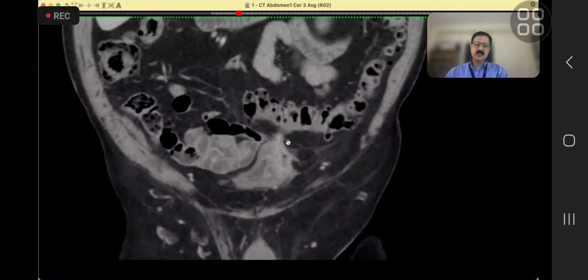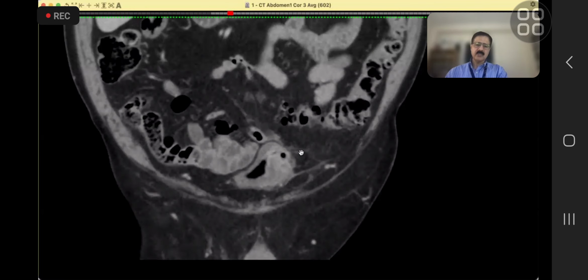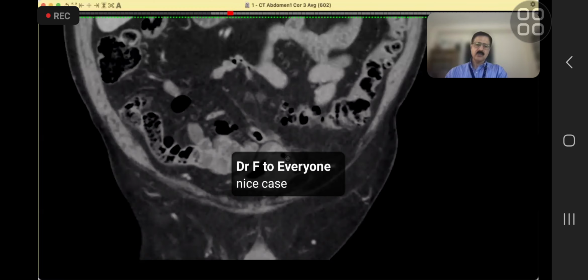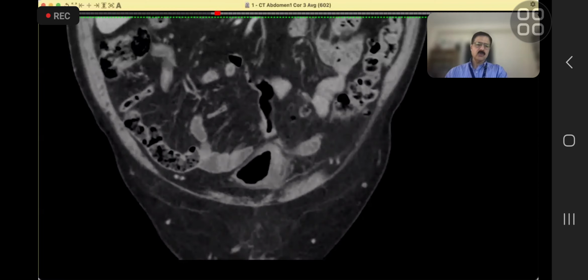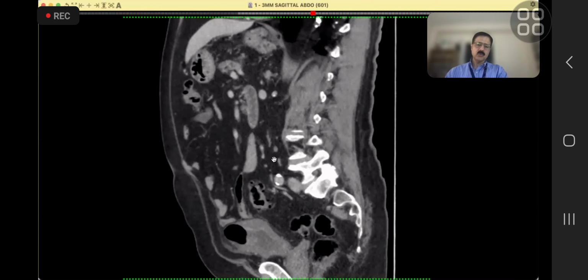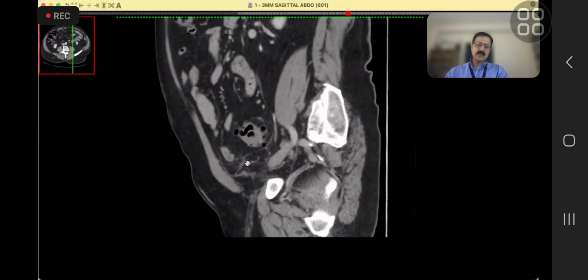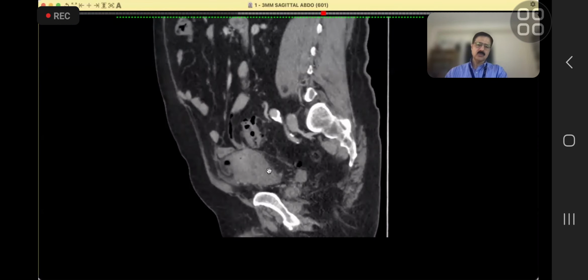Look here, just to show you this is that fistula, how it is tethering the bladder superiorly, how the bladder wall is thickened, and then it goes in. This is intramural, meaning in the wall of the bladder. You can see the fistula communicating with this air. Sagittal will also show it to you, but in the exam, you have to impress the examiner by initially picking it up. So this is sagittal. You can see this fistula going, and then it goes into it.